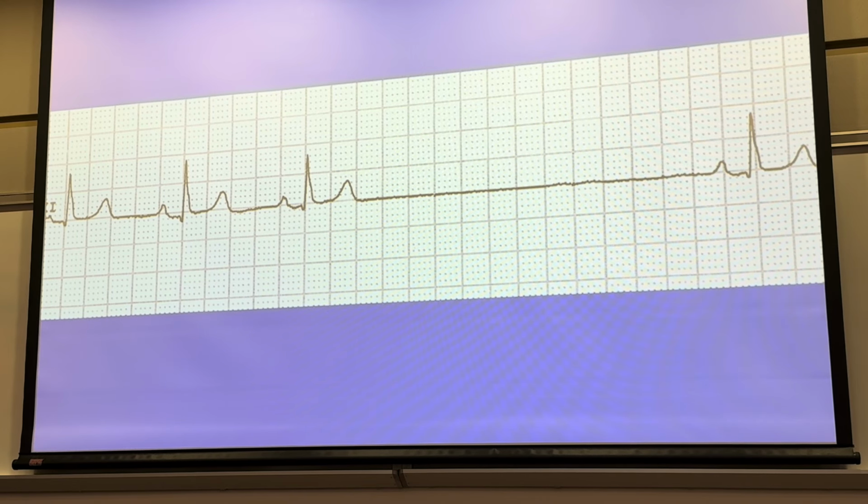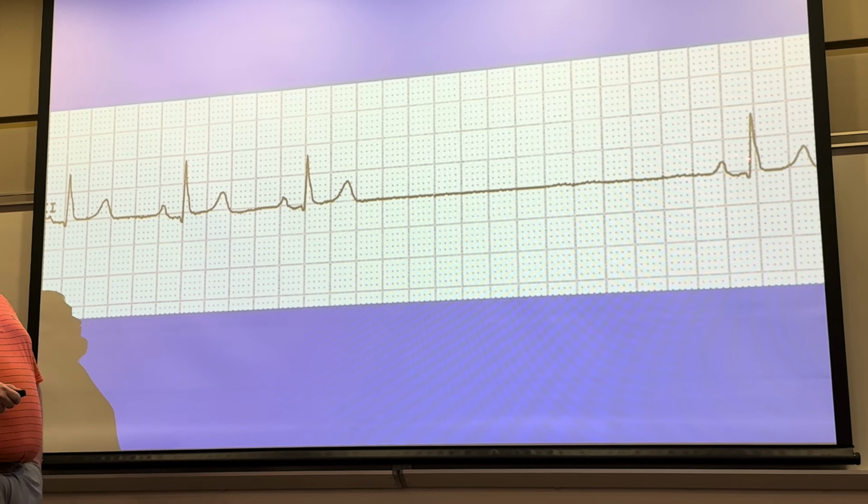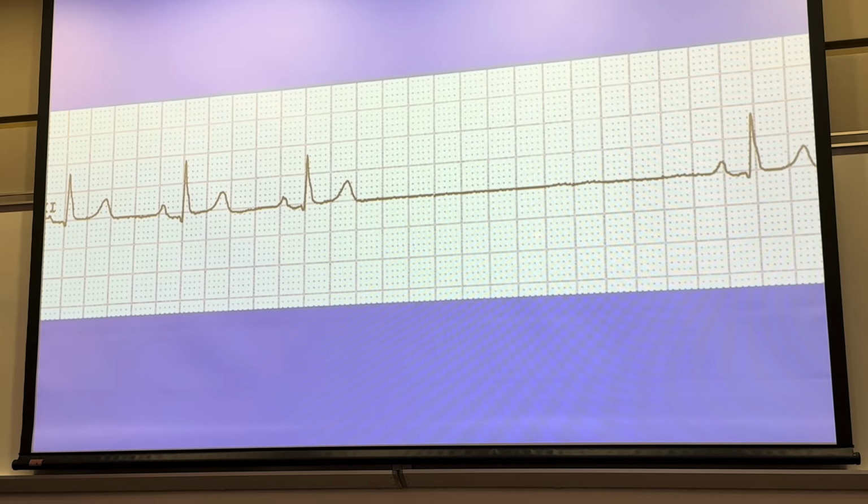So third degree. Not quite. Sinus pause. Here's sinus pause. I like sinus pause. All right. P wave, QRS, T wave, P wave, QRS, T wave. My heart's taking a break. P wave, QRS, T. My PR interval is not prolonged. I have equal spacing in between. So I'm not dropping a beat because I don't have a P wave in here at all, and then no QRS complex. So just, it took a break right here. Sinus pause.